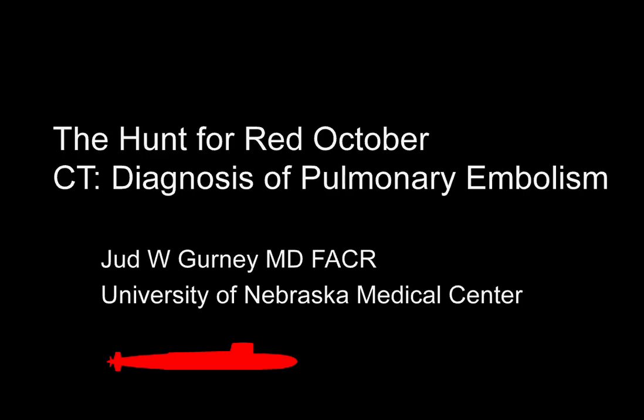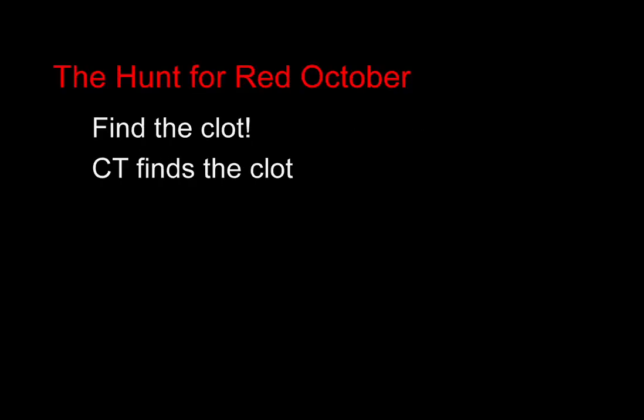The Hunt for Red October is about a silent deadly submarine, a useful metaphor for the diagnosis of pulmonary embolus. PE is all about finding the clot. Examine the literature on pulmonary embolus and you will find that the seminal papers all deal with finding the clot. In this lecture, we will review CT for diagnosing pulmonary embolus.